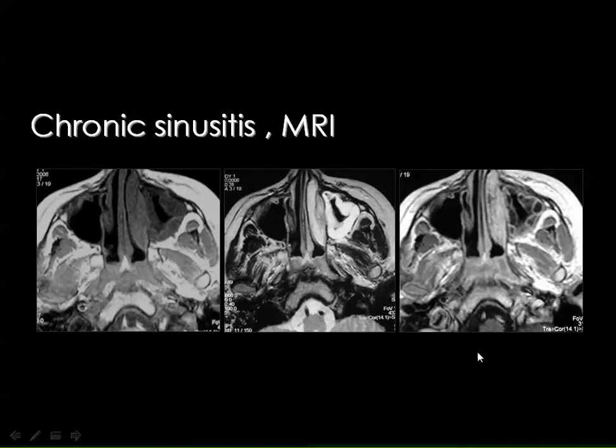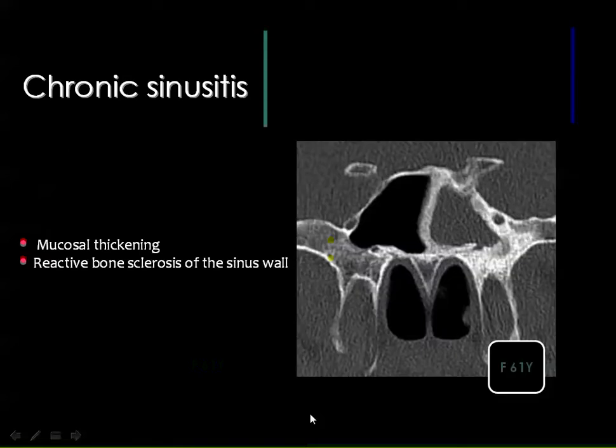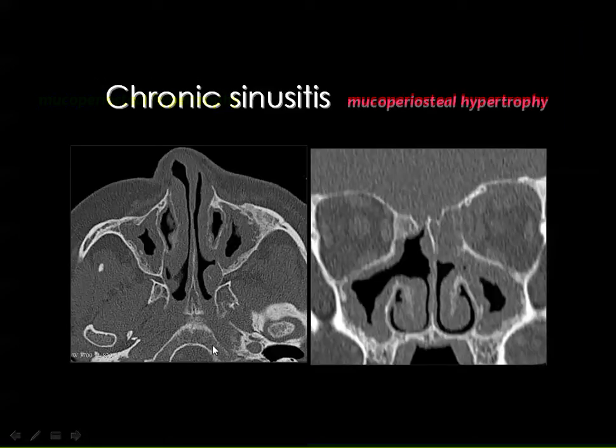a case of sinusitis with contrast media, you will get marginal enhancement, which is almost similar to that seen in any inflammatory process. And one of the manifestations of chronic sinusitis, beside mucosal thickening, is the bony sclerosis of the affected sinus. And here you can see that the left compartment of the sphenoid sinus is totally opaque, and the walls of the sinus are thickened and sclerotic.